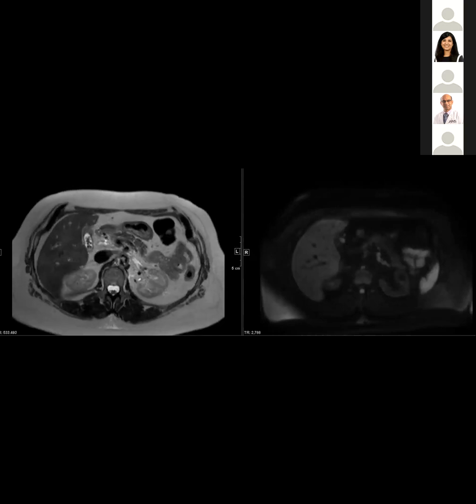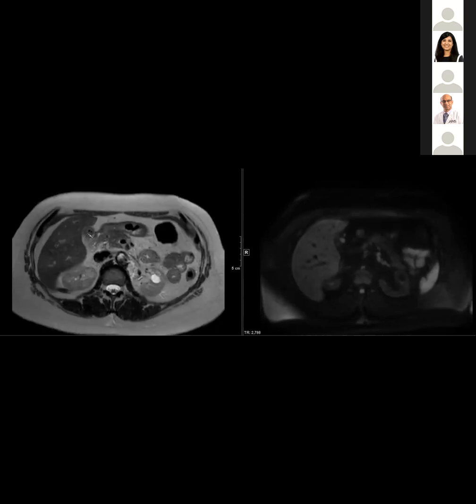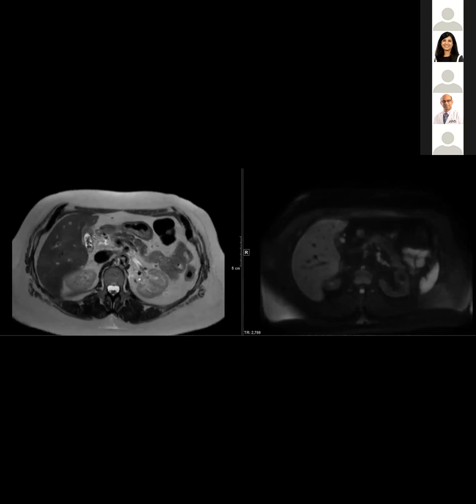The gallbladder came out, and of course this was early gallbladder cancer. So I went back and looked at it again, like this kind of peak-looking thing. We see that with adenomyomatosis a lot. But again, the fact that there's not a single intramural cyst, I think that should raise a flag that it can't just be that. Theoretically, it still could have been adenomyomatosis, but I think there should at least be a suggestion that this could be an early neoplasm.